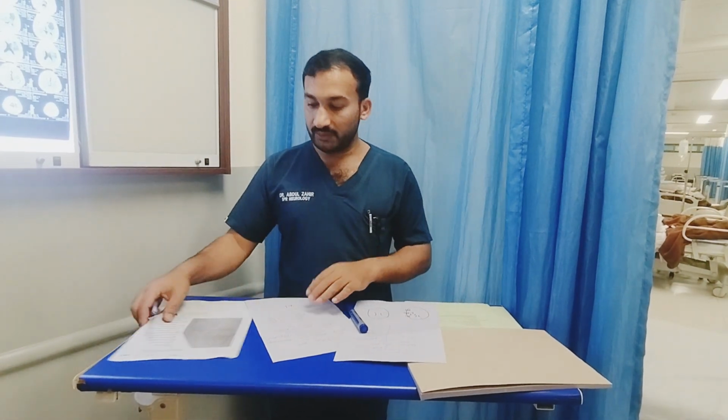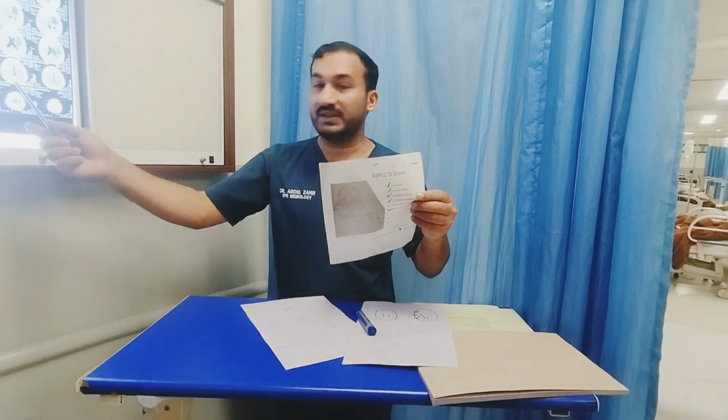So we have started a series of videos on scores in stroke. Today we are going to talk about the two scores we find in ischemic stroke. One is called the ASPECT score and the other is called the NIHSS score. Today we are going to talk about the ASPECT score. On this CT brain I will show you the ASPECT score. So let us talk about it.